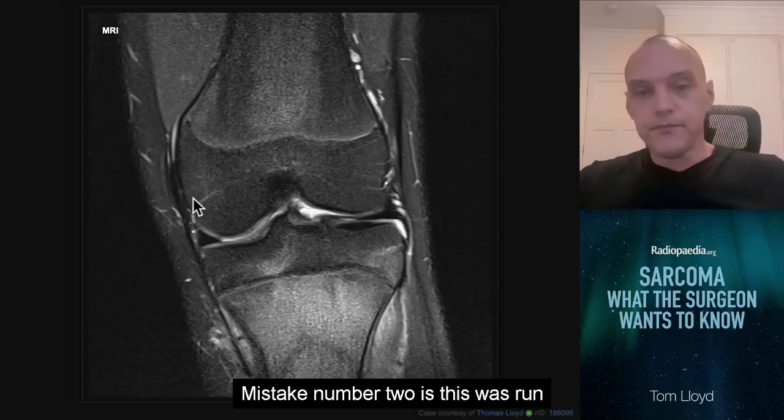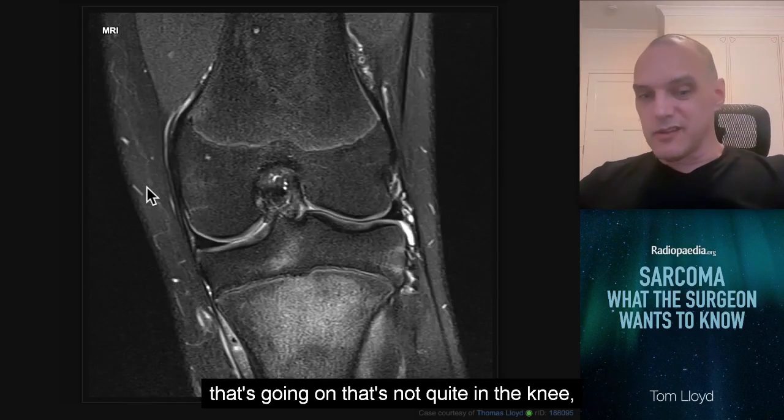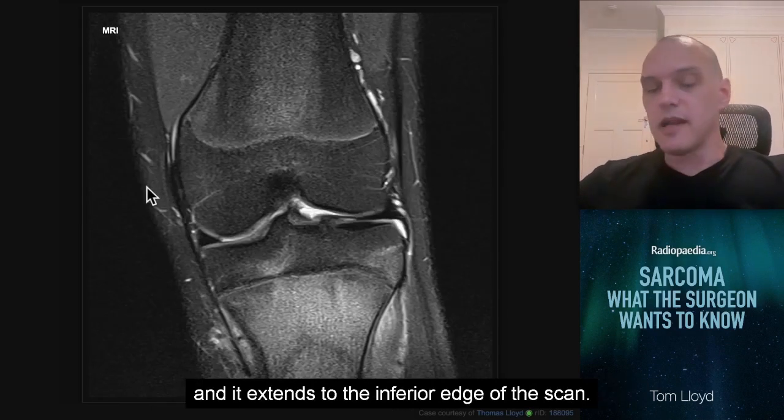Mistake number two is this was run as a knee protocol when obviously there's something going on that's not quite in the knee and it extends to the inferior edge of the scan.